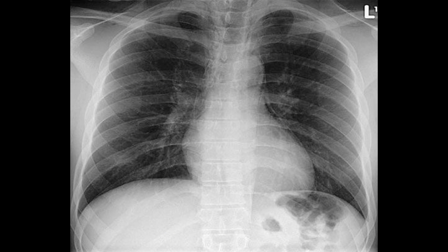behind the heart. Occasionally, air may dissect between the fascial planes of the pectoralis major, producing the so-called ginkgo leaf sign. It is important to note that pneumomediastinum does not change with patient position on decubitus imaging, unlike pneumothorax or pneumopericardium, where the air moves to the non-dependent side. Pneumomediastinum can coexist with a pneumothorax, but a pneumothorax itself does not cause pneumomediastinum.